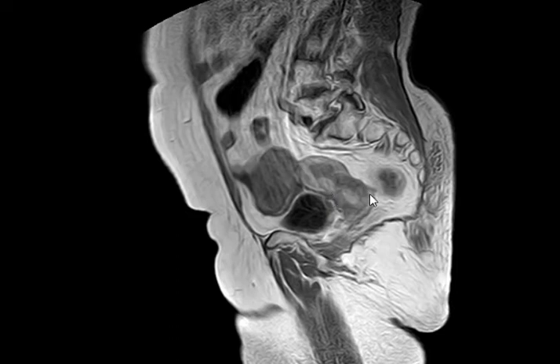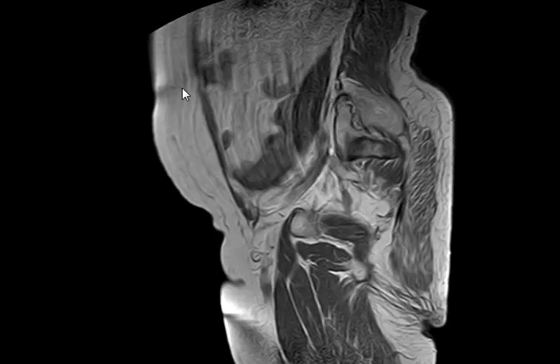So, first of all, this uterus is way too big for 90 years old. A 90-year-old should have a very small, tiny, atrophic uterus. Second, a uterus in a 90-year-old with fluid signal intensity in the endometrium is definitely abnormal. Let's see.